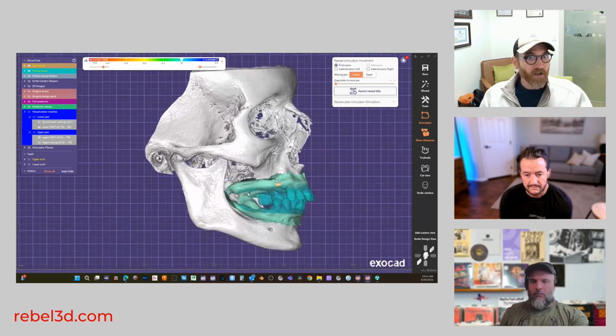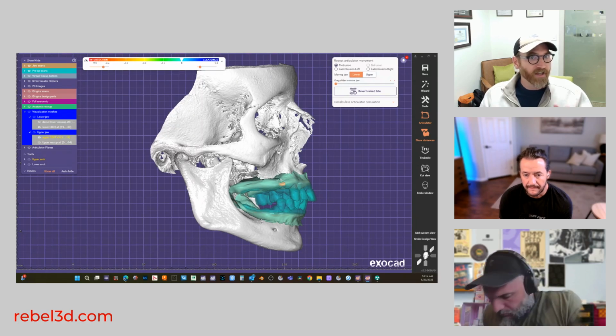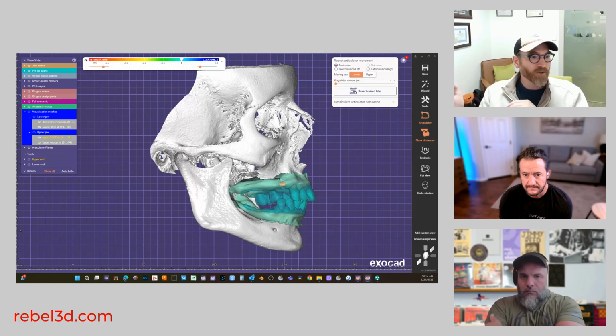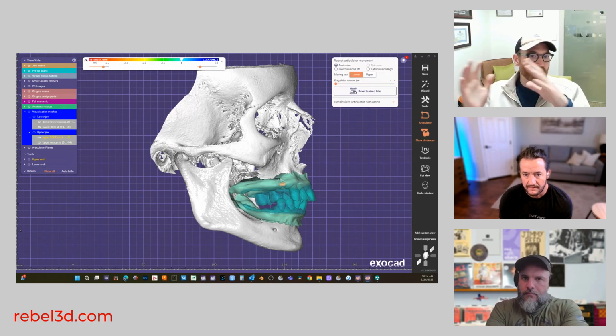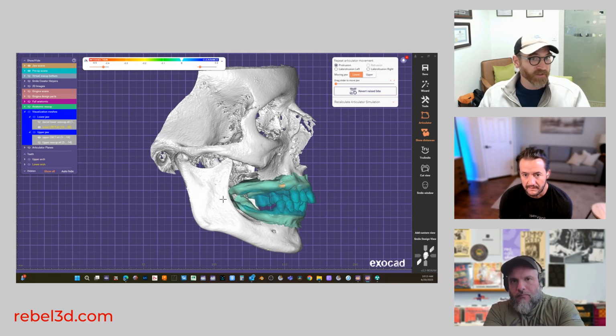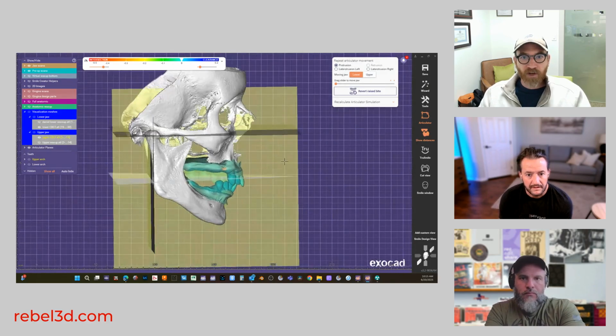And so I do this for diagnostic reasons, but I also set the goal here to have a reference, a 0 point from which we can always go back and forth. When I do the digital conversion, I want to move everything back into this wax up coordinate system. That's the goal, because that's where the wax up lives. It lives here.